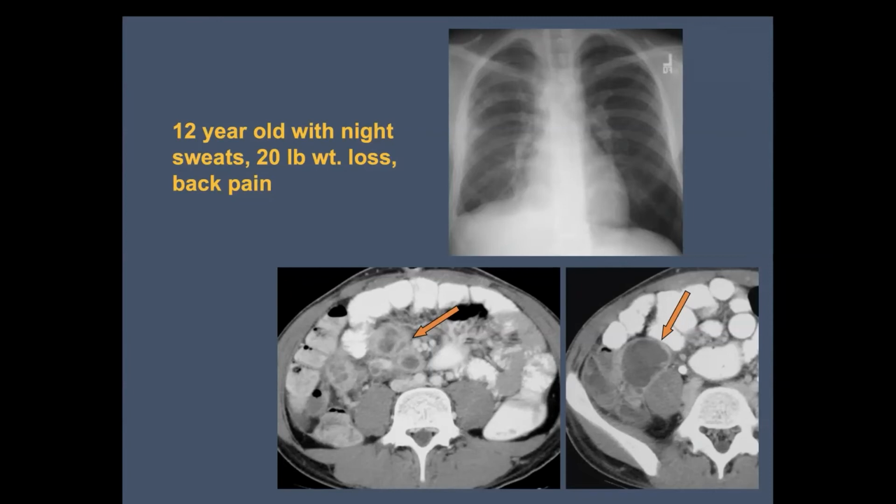They're often most prominent down in the ileocecal region, the right lower quadrant, and if you get pain from those, it can mimic appendicitis in some cases. But you won't get this kind of lymphadenopathy with most other kinds of inflammatory processes in the abdomen. It would be very unusual. So this is quite characteristic for abdominal TB.